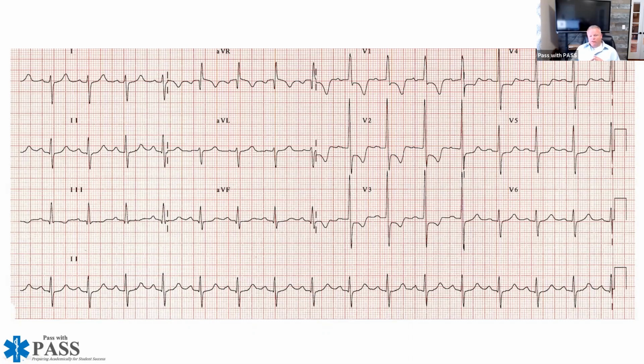All right, so if we look at this, a couple different things we can look at. We should be looking at the EKG as a whole, and probably what most of you are doing, and what your eye is trained to do, is immediately start looking for elevation, right? So if we do that, I look at lead 1, AVL, V5, and V6. I don't really see any elevation there. I go to 2, 3, and AVF. I don't really see any elevation there.